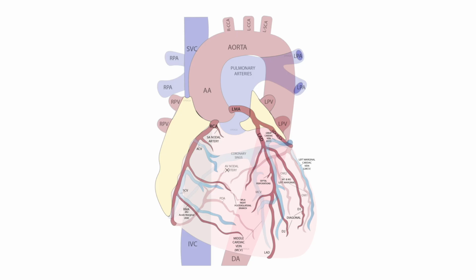But anytime you get blocks, you have to start thinking, why are they happening? Is this patient on too much medication? If not, then what else is happening? Maybe something happened to them, some test that they were doing at the hospital, and the consequence of that is a transient second-degree block. You can have transient complete heart blocks.